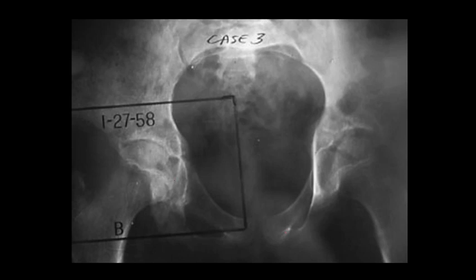26 days later, well, now we're starting to see more of those infectious changes. So in 26 days to lose that joint space, that is an aggressive change. And that is a lot of evidence towards an infection, because tumors aren't going to affect the joint themselves or the joint only, versus an infection where we can see kind of that joint change by the chondrolytic enzymes that can be created by various infective organisms. We're also starting to lose some of that nice subchondral white line, so it doesn't look as well visualized here anymore.